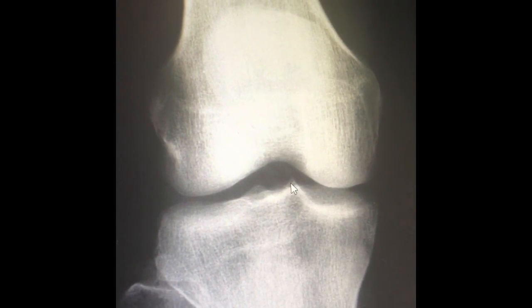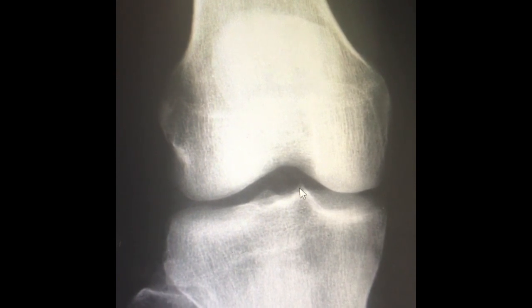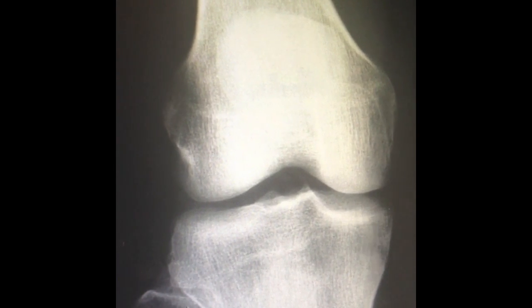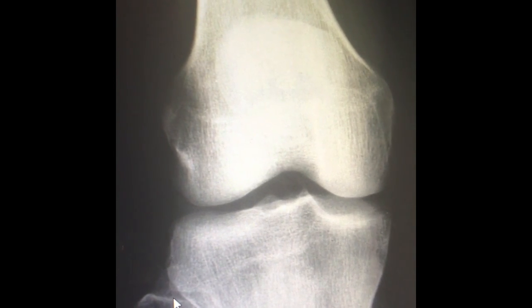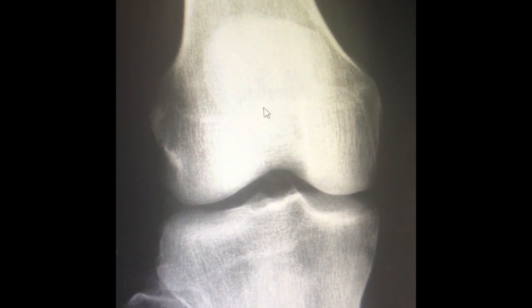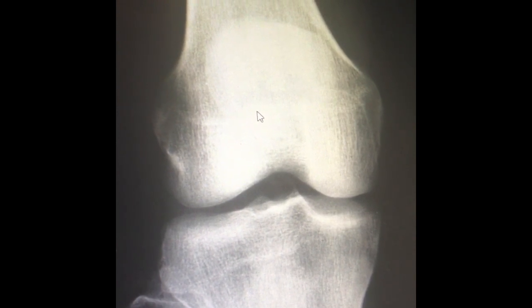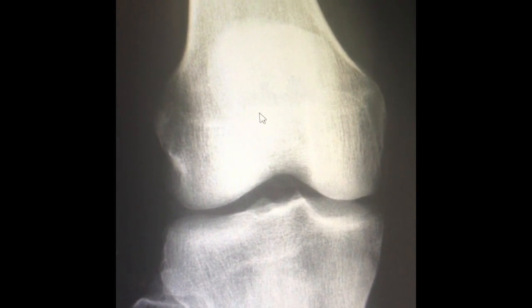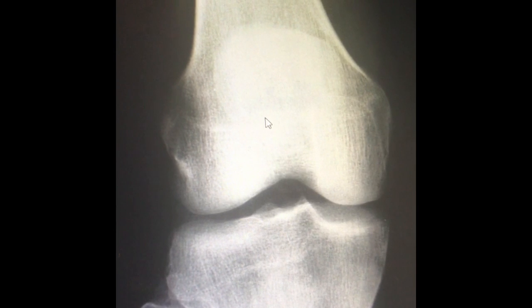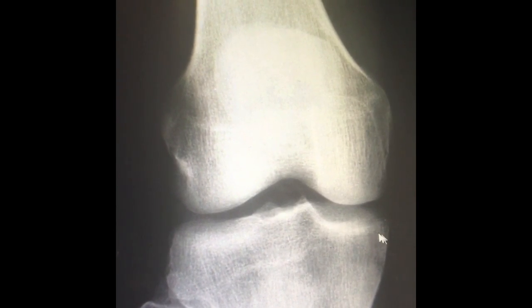And then we also want a slight superimposition of the fibular head on the tibia, which is quite normal. And then also looking for the patella being completely superimposed on the femur, which can be found right over here. And also looking out for open femorotibial joint space, with the joint spaces being equal on both sides of the knee, and that's primarily the reason why we use a tube angle.